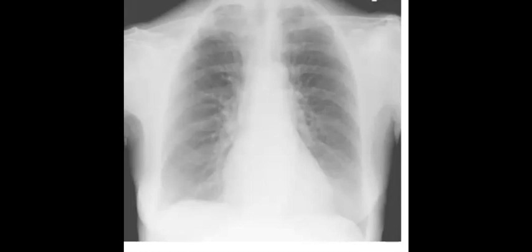And S for what? Marwa, yeah. Scleroderma, then you will search for dilated esophagus, and again lower lobe fibrosis and soft tissue calcification. So scleroderma, hyperpara, infection, rheumatoid, and trauma. So this is the differential of the distal clavicle or lateral clavicle resorption. Okay?